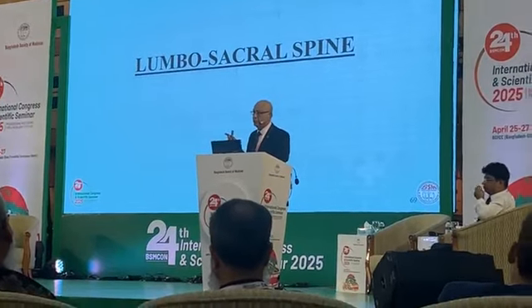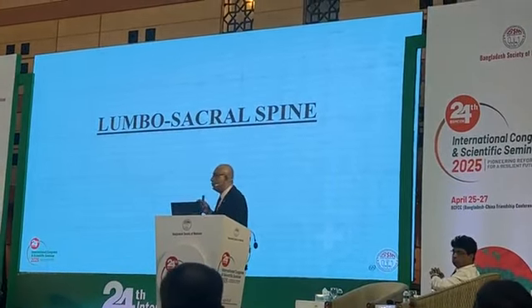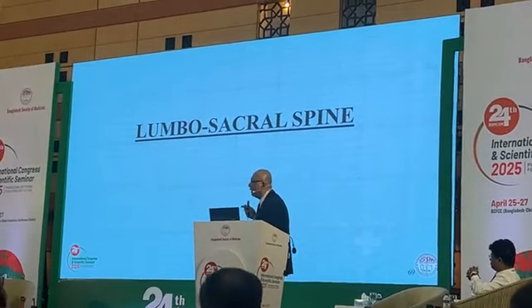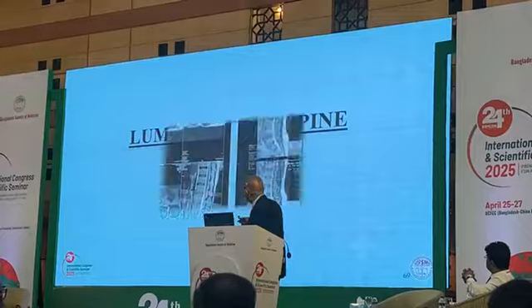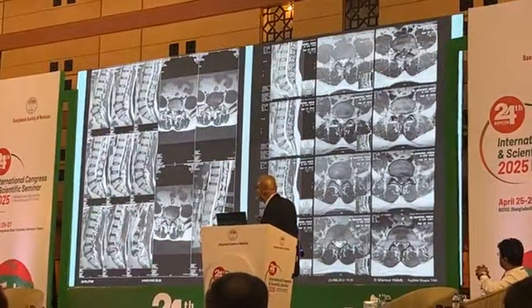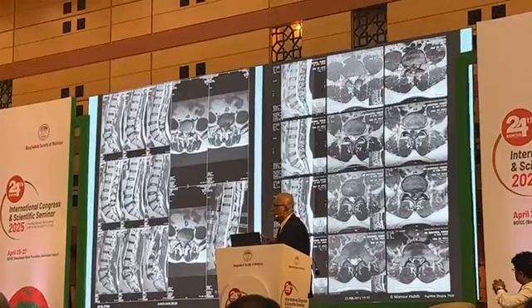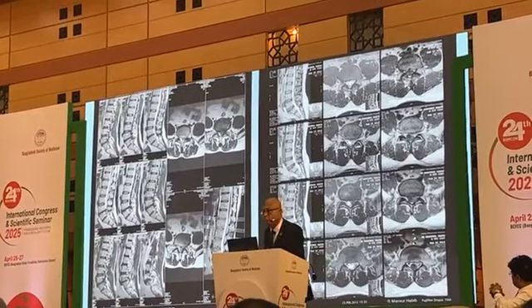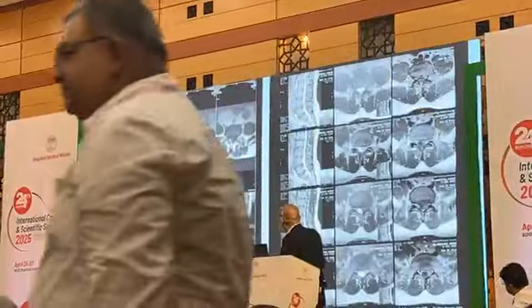because probably that is the commonest MRI done, in my experience. I'm not sure about the statistics, but probably lumbosacral spine MRI is the commonest MRI of the spine. And we do those mostly for prolapsed lumbosacral discs, causing a lot of problems like lumbago and lumbago sciatica and a lot of problems.